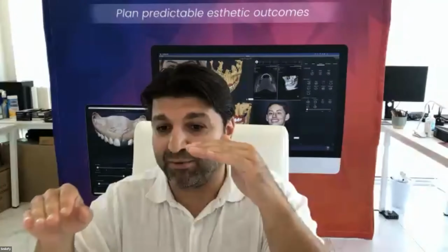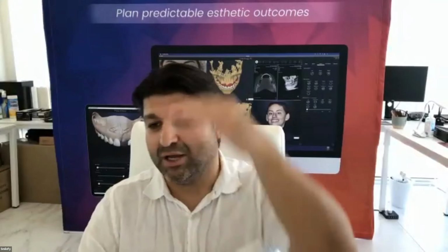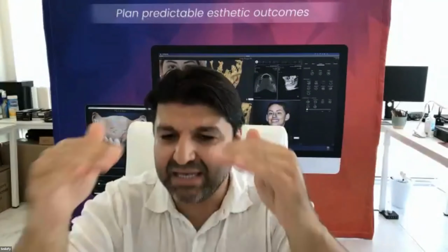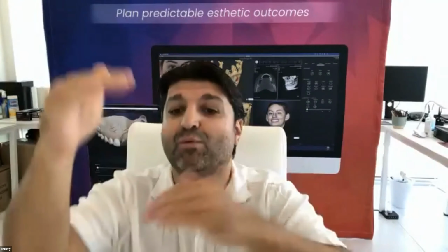In our project metrics, and that's unique, if another system works like this, beautiful, but I don't think so. You can jump from the original design to the mesh edited design. If you do CAD operations, you can have the metrics on CAD operations, so you can switch between all the versions of your design. You have original, you have mesh edited, you have CAD features, and you do have all these layers immediately accessible if you want to jump back.